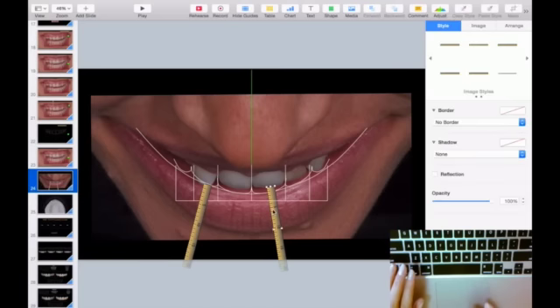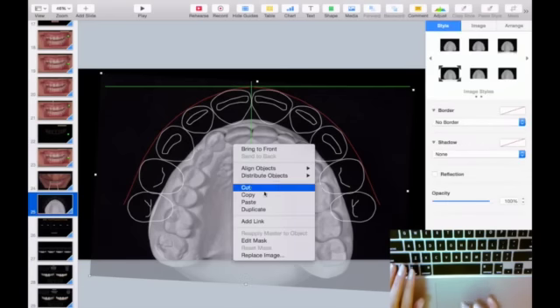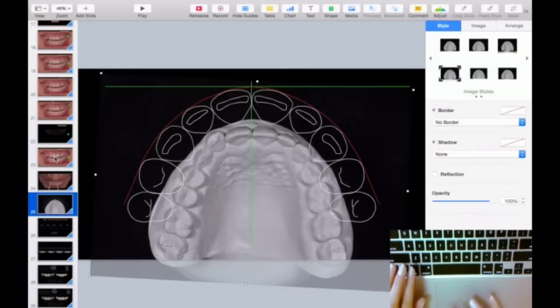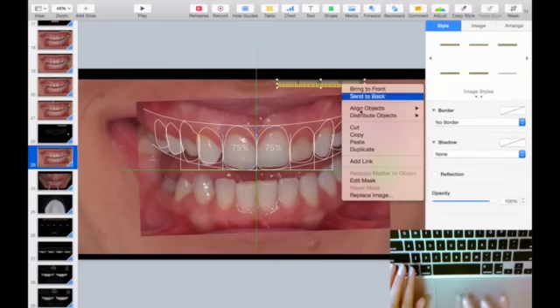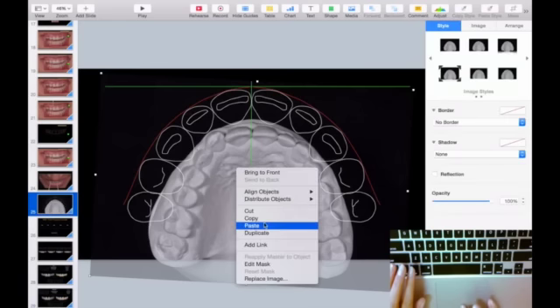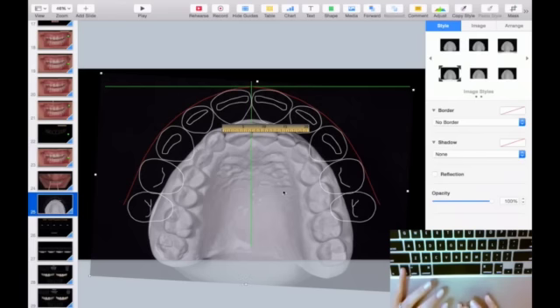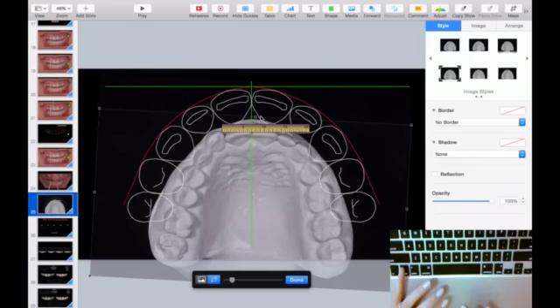So I go there, I take this, let's take it from this one so it's already this way. Okay, copy, paste, and I make sure I have 16 here. Let's mask it because it's too big to work with.